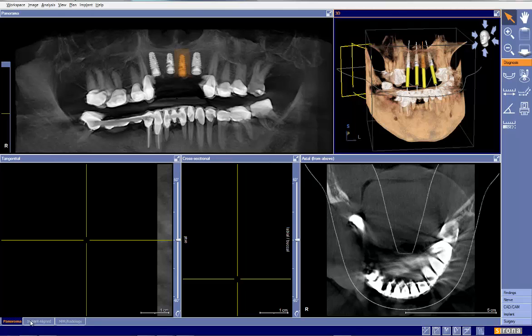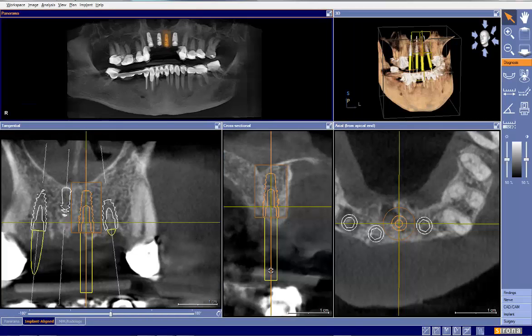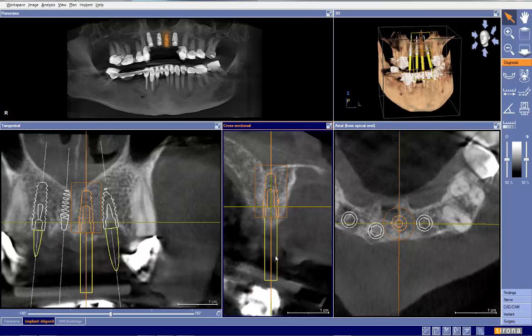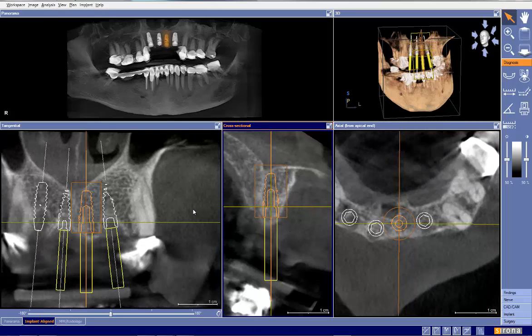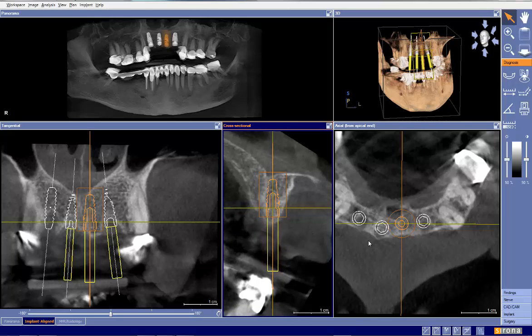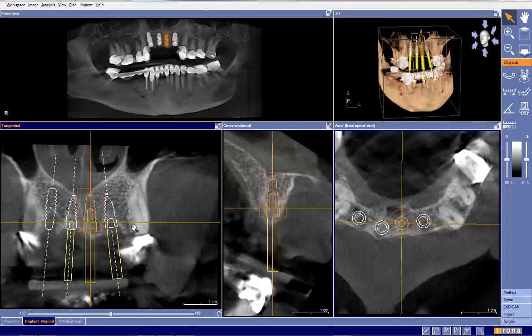So that leads me to our next point, which is that doing an implant plan here will be a bit difficult without having any tooth data here. So we're going kind of blind here, basically placing the implant where maybe bone is, but not knowing where the tooth is going to be. And then what that does is it may put us in a prosthetically difficult situation here. So let's go ahead and talk now.